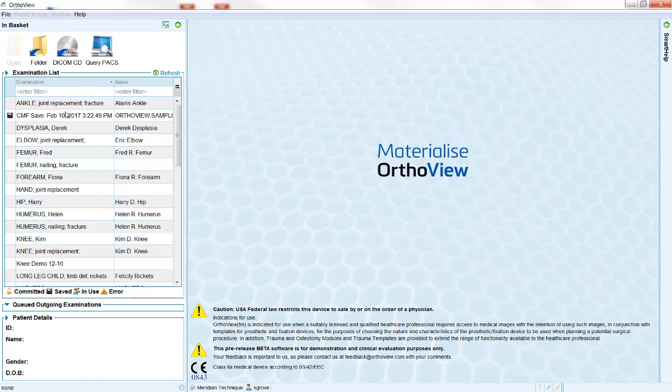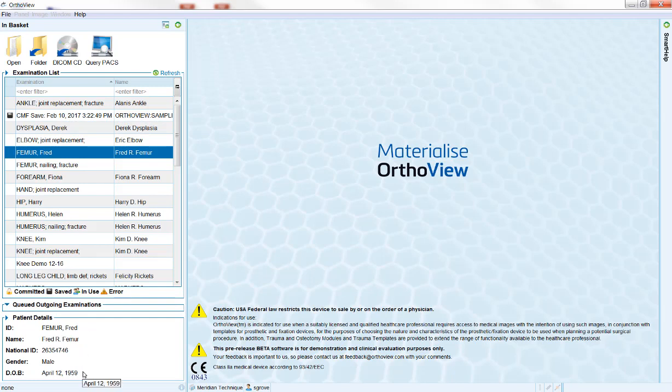Once studies have been imported, they will be displayed on the examination list. Selecting a study on the examination list will display more patient details at the bottom of the screen. To open a study, either select Open at the top left or double-click the required study.